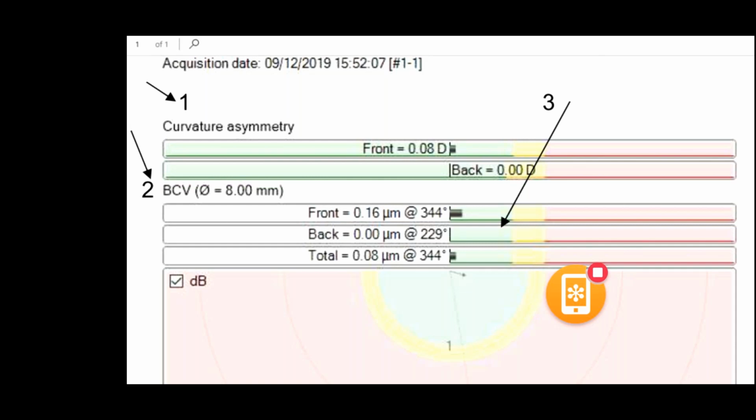It's analyzing a normal cornea and analyzing the patient's cornea, and then it's comparing the ratio at which it is becoming steep. Like we know that the cornea is prolate, steep in the center and flat in the periphery. So a prolate cornea should be steep in the center and not more than that compared to the periphery. This is what it's comparing, the curvatures in the same eye. It's basically taking a tangential curvature, the tangential reading, not the sagittal reading. These are very, very fine. And he's talking about the front and the back asymmetry.